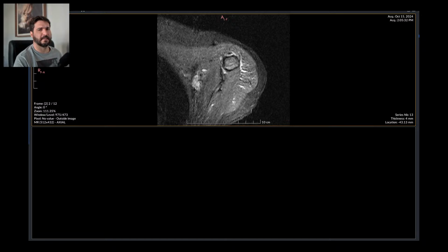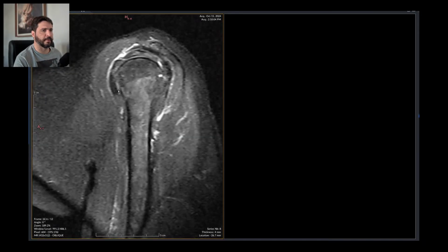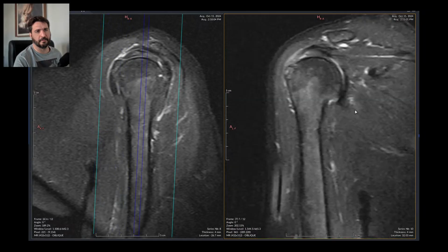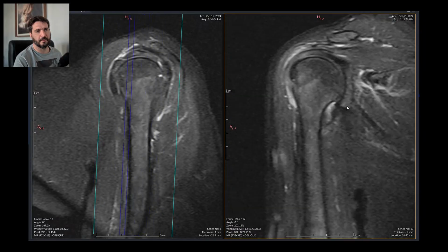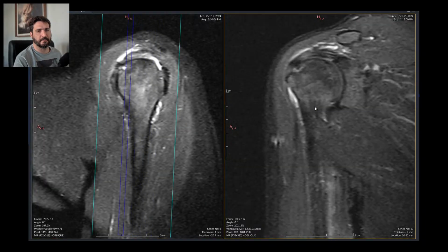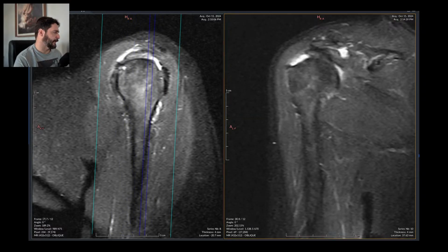Because let's see if I am anonymizing this. Yes, I am. There is no private information in these images because it's illegal to do so, and we are not here to commit crimes, just to report MRI scans and maybe some CT scans. So this is the shoulder.